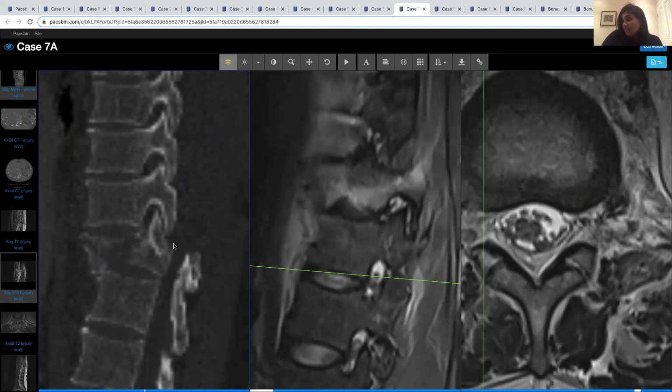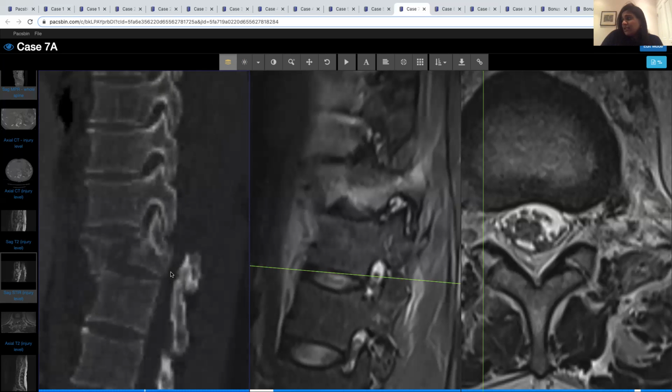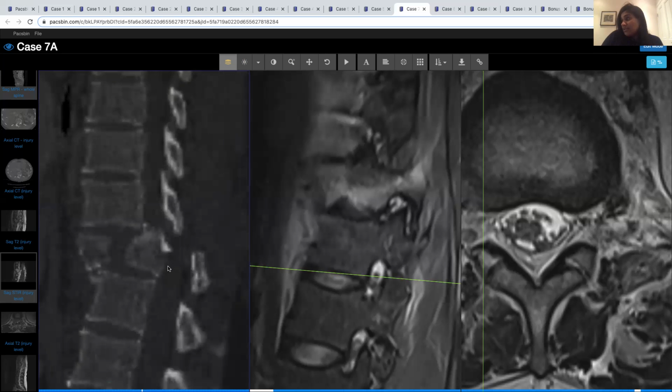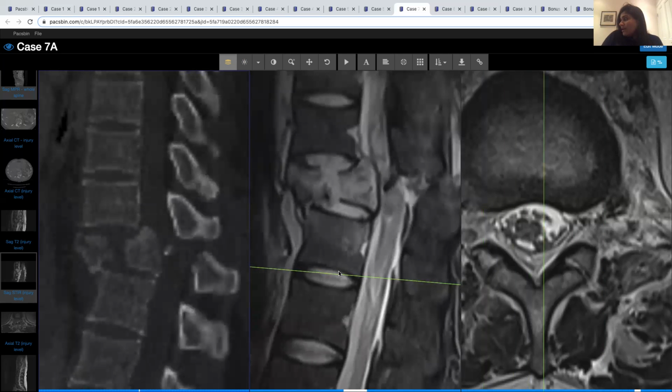And you've got these superior articular processes, which have been split by these pars fractures, have migrated forwards anteriorly with the translation. They've been pulled with it and into the neuroforaminae bilaterally at this level. So we are going to have a PLC failure, posterior tension band failure, both of the osseous and the ligamentous components at this level.